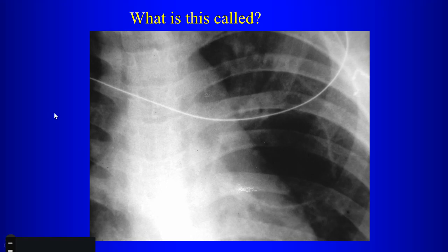What is this called? Well, it might be a bulla, lung cyst, but you have an air-containing lesion that is round and has a very thin wall. Pneumatocele, right? It's a particular term for that. So pneumatocele, what's the difference between a pneumatocele and a bulla? Size. No, I thought it was size. No, not necessarily, no. Bulla is associated with the pleura. No.